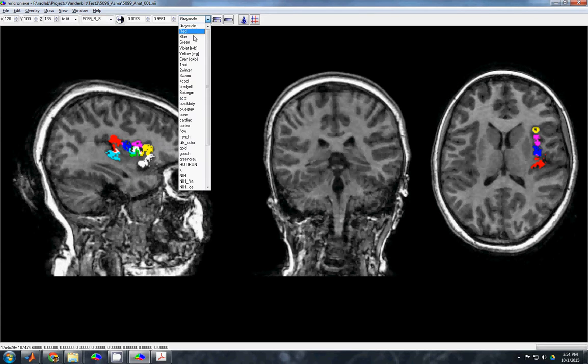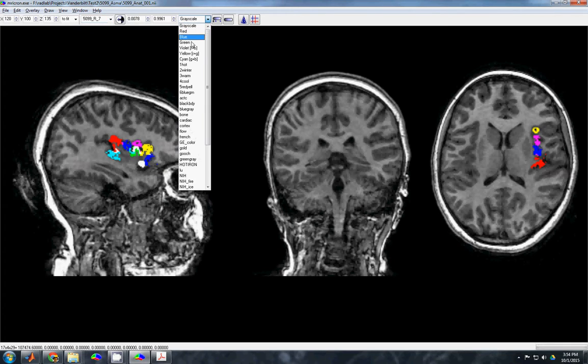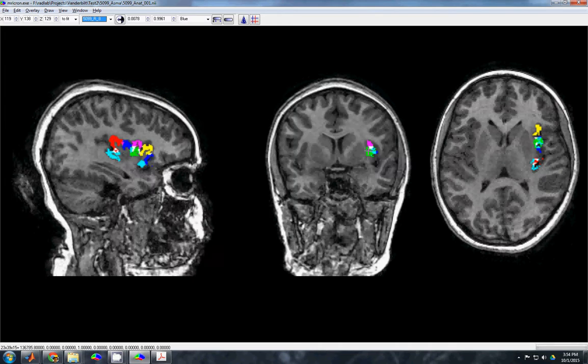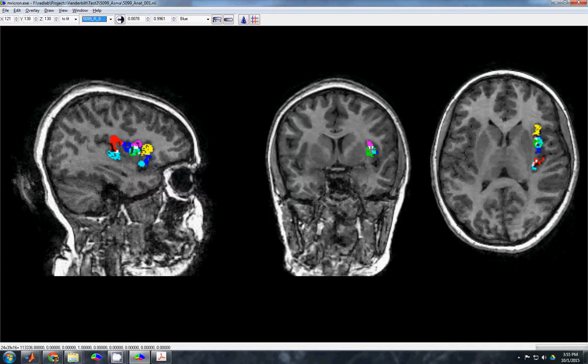I'm going to turn number 8 into blue. You can see that down here, that's just turned blue. I'll turn number 7 into something a bit more appealing too, maybe a nice cyan. 6 already colored in, 5, and then this looks like it could be 4, 3, I'm not sure. The rest of them all actually have some color, and the white here is for overlap. I wasn't sure where the division is. So your final result is going to look something like this with a few caveats, but we'll go into that in just a second. And same thing for the left side of the brain, right?